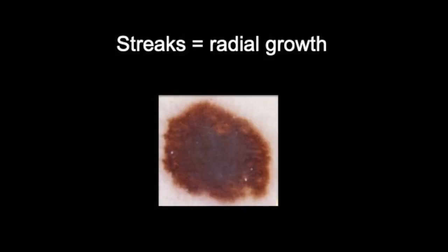And in the classic Starburst nevus, the same. So here is a very early form, and then if you were to follow it over the course of time, it will become symmetrically larger. These are the Reed's nevi, the streaks and pseudopods, thinner and sparser, and eventually when that lesion enters senescence, you will have a homogeneous brown nevus with a central bluish hue. That's the Spitz-Reed's nevus, right?